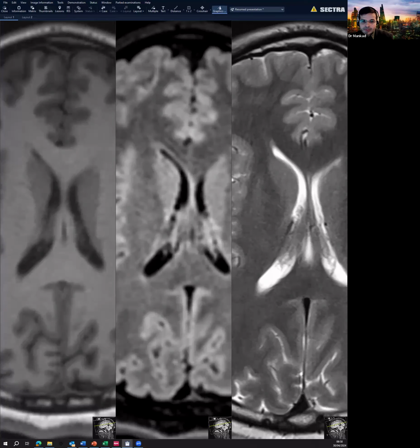So, multiple sequences have been generated since the advent of MR, and new sequences continue to be developed. But I can tell you that the core sequences have not changed. So, if you go back today being able to identify your T1, T2, and FLAIR confidently, then I think you are already on a winning streak. There are some other important sequences. So we will look at that, and then we will look at some sequences essentially in an immature brain.